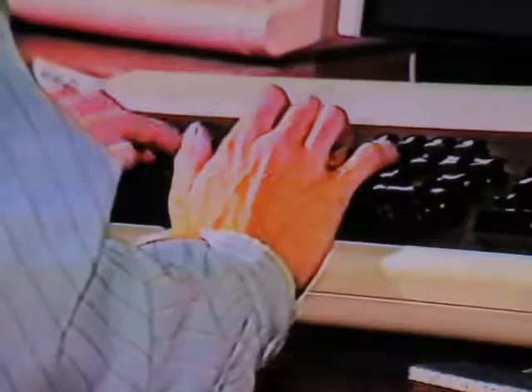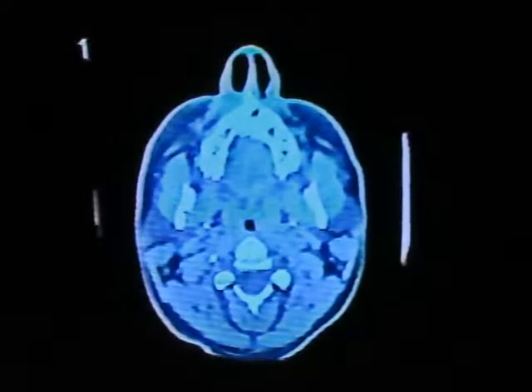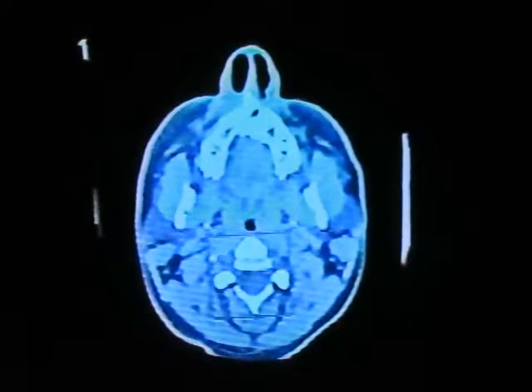Interactive facilities include three-dimensional rotation via a trackball, slicing and multiplanar reformatting, interactive segmentation through grayscale thresholding, and the display of dynamically changing objects. After the images are acquired, two-dimensional slices are displayed on a monitor so that the user may select a three-dimensional region of interest for display. The user selects the region by positioning the cursor via a graphics tablet. The region of interest is then loaded to the Voxel processor.